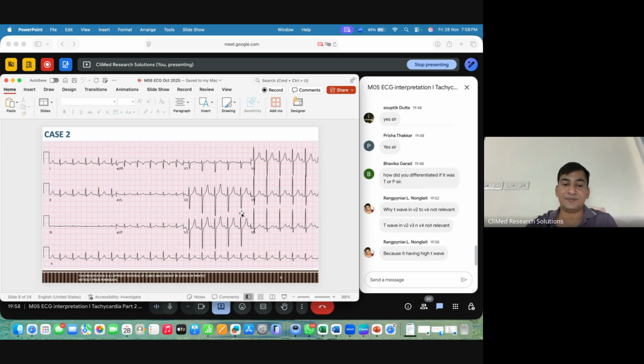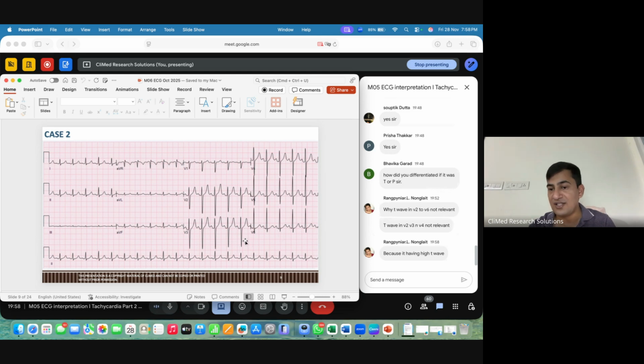No, no. See, this is just a high heart rate, and because of the high heart rate, this is just a voltage difference, but the phenomenon is normal. The criteria of the rhythm is normal. There is a voltage difference, that's all. Voltage difference could show a tall T wave, or a lesser T wave, or P waves. This is because of voltages. The problem is with voltage.